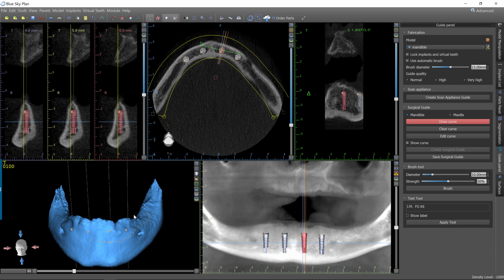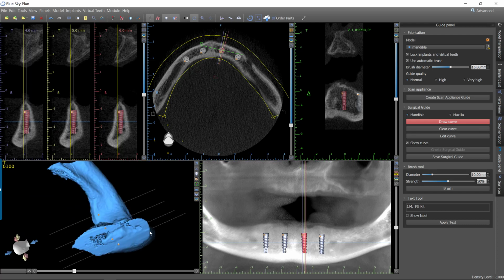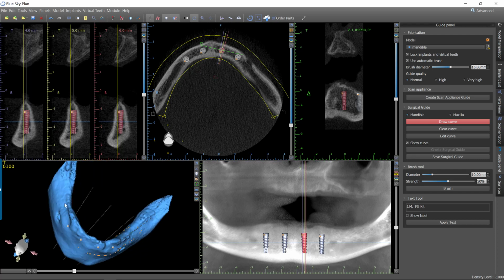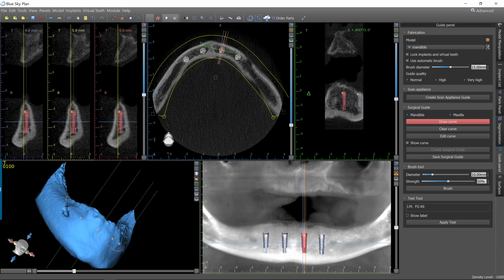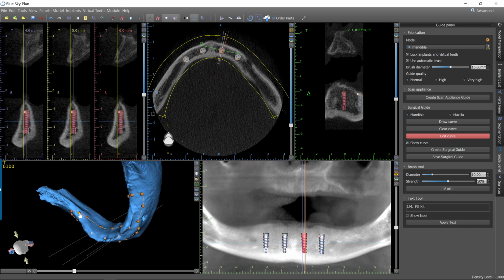So drawing the outline right now, and I really over contour these. I know that's way deeper than what I would want whoever's doing the surgery to have to place that deep in the mouth and reflect that far back, but because you never know exactly how much guide you have to spare when making these cuts and still leaving some perimeter to the guide for strength, I like to just over contour this, and then if need be you can come back and reduce the borders and such after you've seen how much bone reduction is required.